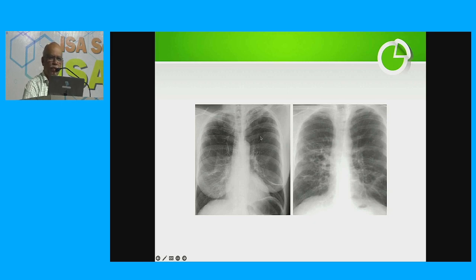So if a patient comes with this sort of film for a thyroid surgery, for example, what anesthetic implication does it have? The examiner asks. This can be a lung cyst, congenital lung cyst, emphysematous cyst. In such cases, under anesthesia, with hyperinflation the cyst can rupture and produce a pneumothorax, or with nitrous oxide it can get enlarged. Spontaneous pneumothorax.